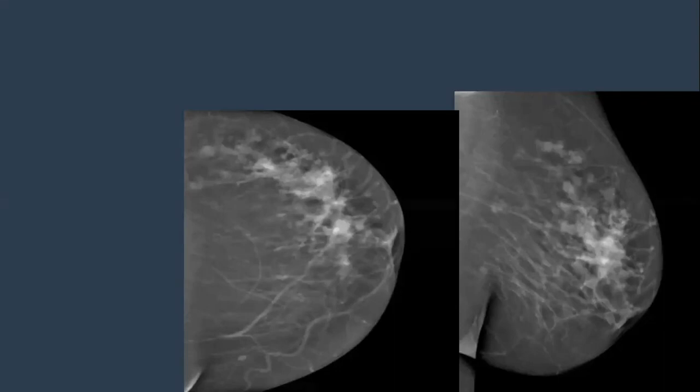Then definitely we are talking about distortion. What else? The approach. Distortion. Where? Is there any associated calcification? Are there any associated features? That is it. Just tell me there is architectural distortion, by location, and what the associations are. This is the whole approach.